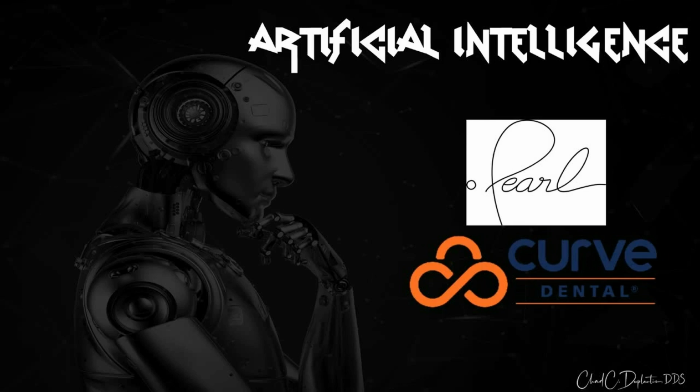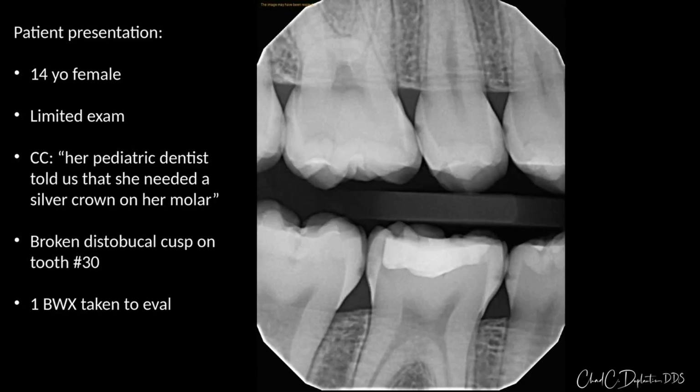Recently, two companies that I'm very fond of, Pearl AI and Curve Dental, have joined forces and they've created a platform to where through your practice management software, if you're a Curve Dental user, you can very easily obtain the artificial intelligence second opinions of your dental radiographs. So, what I'd like to do is walk you through a case that came into my practice recently.